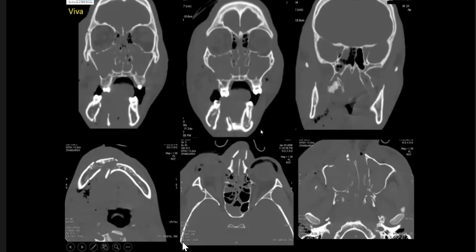There is fracture of the anterior wall of the right maxillary sinus, bilateral nasal bones, and comminuted fracture of the symphysis menti. There is some diastasis of the right frontozygomatic suture, where the haemosinus is involving the bilateral maxillary, ethmoid, and sphenoid sinuses. So this is likely suggestive of a Le Fort fracture, and the type is likely 2.